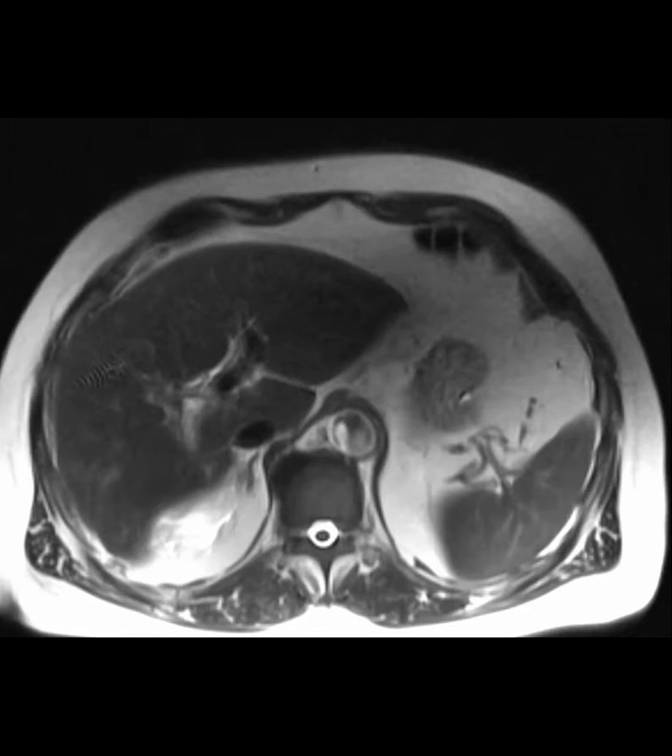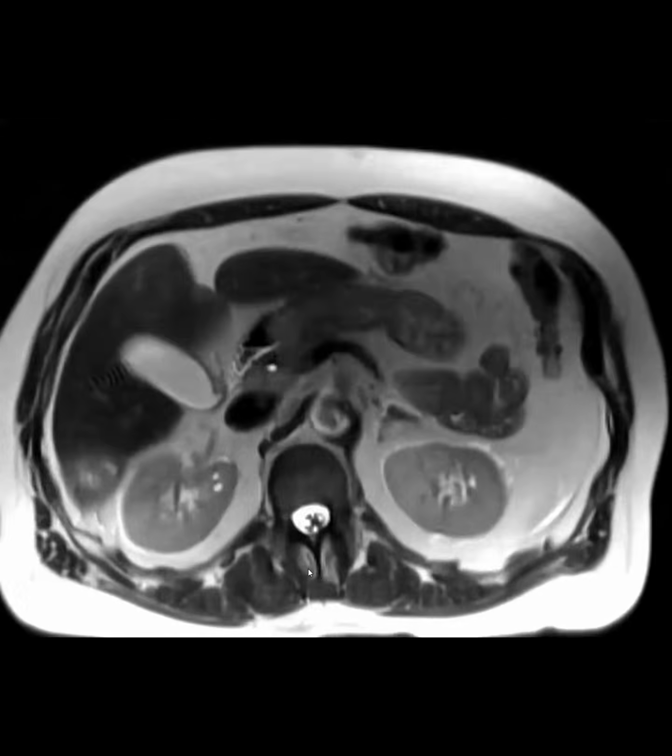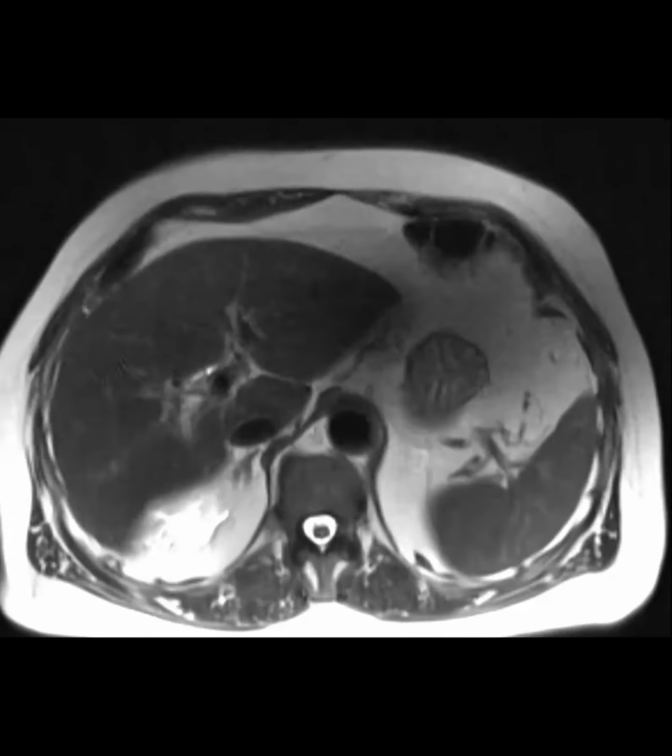What led to the MR? I don't know actually. Let me see. Maybe the CT was wishy-washy, non-diagnostic. They basically said indeterminate lesions in the liver could be abscess versus focal lesions. Recommend MR. And then also there was some other renal and adrenal stuff going on. So anyway, okay.